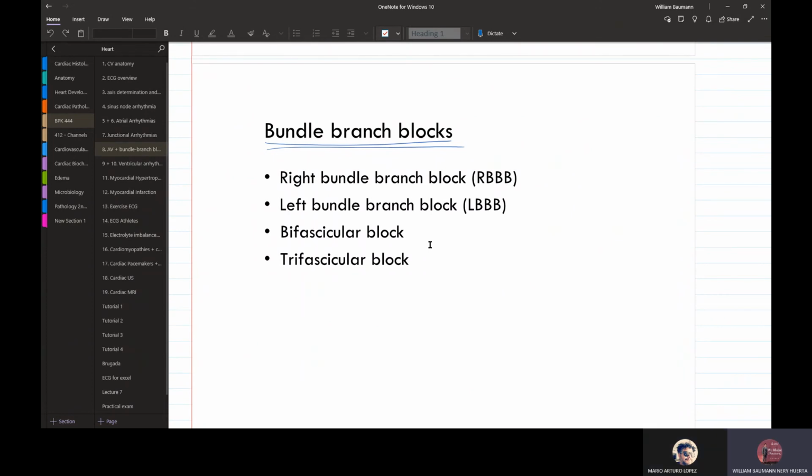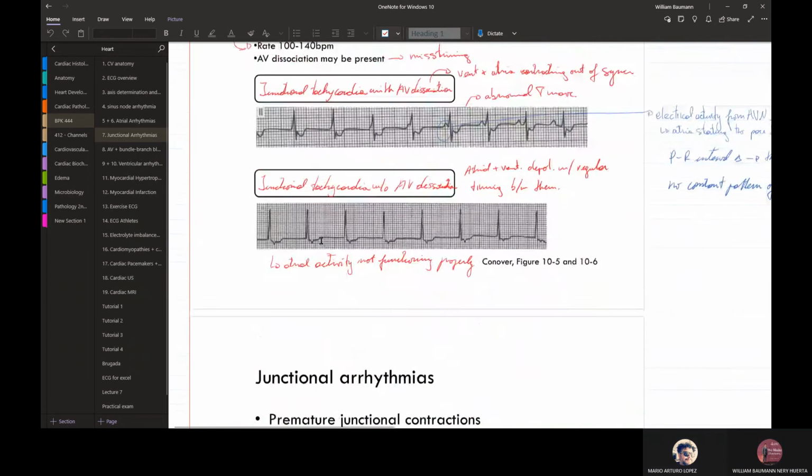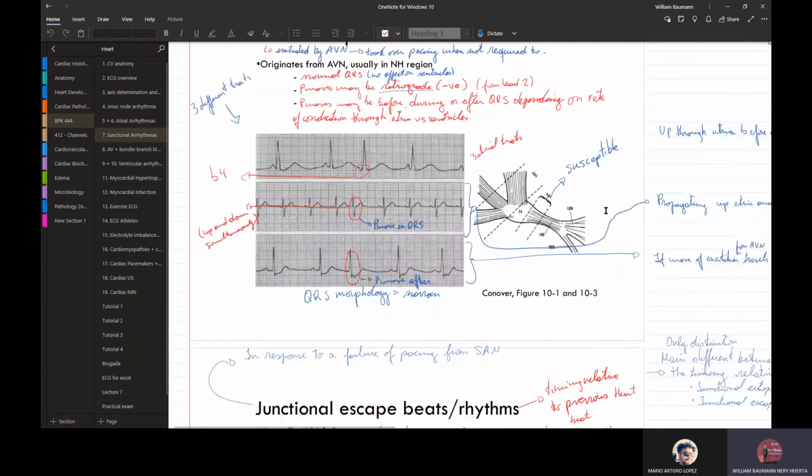We're going deep into the ventricles now. This is below the bundle of His, or I guess after the bundle of His. Remember we looked at this one. I think this is the bundle of His. I'm not sure, but you see how here is the separate. Yeah, I think you're right.